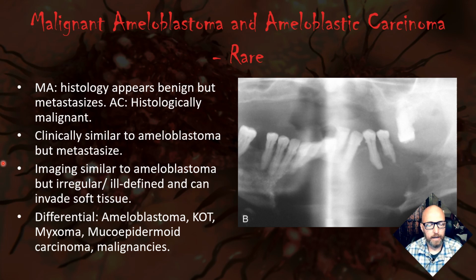And clinically, they may appear similar to ameloblastoma. You see, it does kind of have that soap bubble shape, somewhat well-defined smooth borders, but at the same time, it looks a little bit more destructive. And so start thinking of one of these if you see something that looks like ameloblastoma, but maybe it's starting to have a few signs of malignancy or has ragged borders, it's destructive, leaving these teeth floating in air.